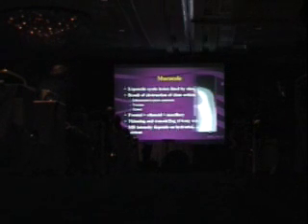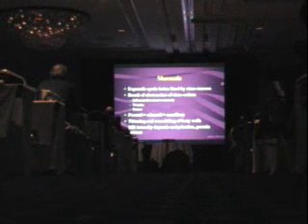What if you have a lesion that's at the olfactory groove or at the cribriform plate that either grows up into the brain or down into the sinuses? That's probably the only other important tumor, olfactory neuroblastoma or esthesioneuroblastoma. Okay, those are all nice. The only thing you're likely to see on an exam situation is a mucocele. And people see them every year.